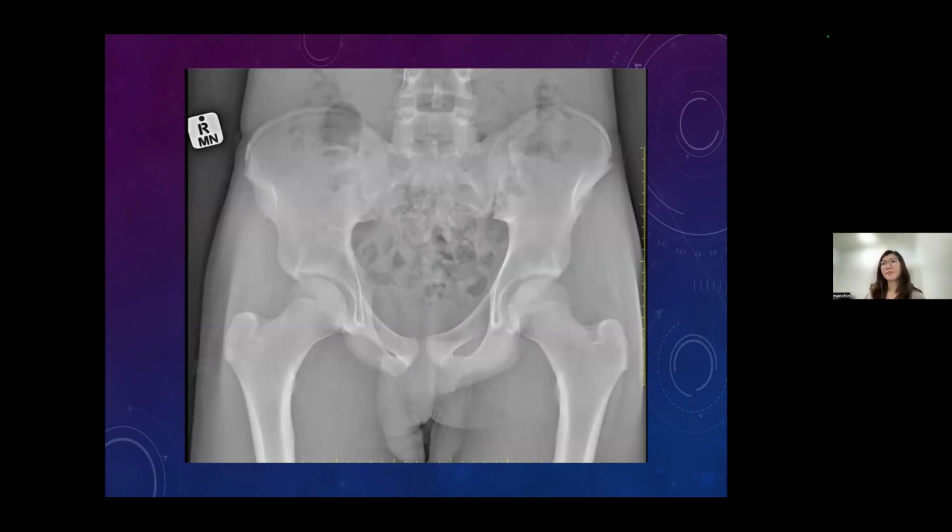Okay, come on, guys. When I show you a pelvic bone X-ray with a fall, you definitely need to look for fractures, right? Acetabular wall fracture? Not accurate. So which part of the bones is fractured? If we cannot find the left pelvic brim, which part of the pelvic brim are you talking about? You may be correct, but which part? For me, the pelvic brim will be this region, but where is the fracture?